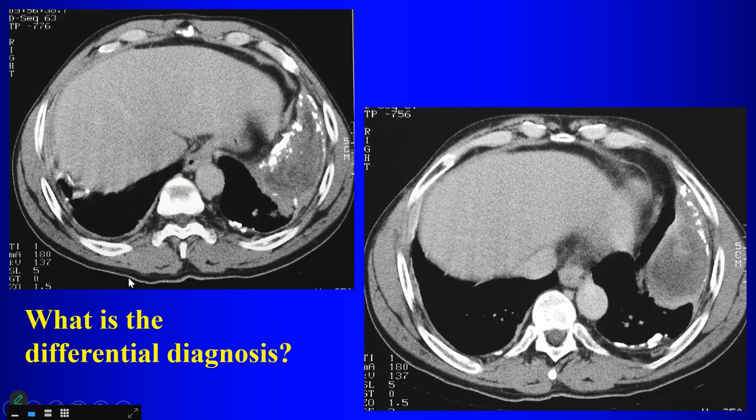Okay? So what's the finding here on the CT? Calcified what? Pleura. Yeah, you have calcified pleura, and this stuff in here is a loculated collection, right? So what could cause this? Chronic empyema. Very commonly from tuberculosis. This was a case of chronic empyema from TB. There were viable organisms there when they tapped the fluid.